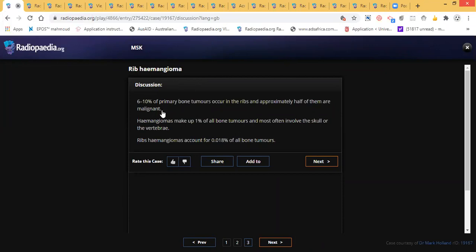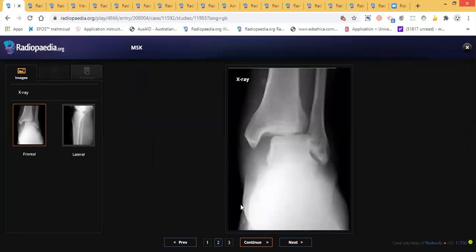Yes, let's go to another case. They like it in the MCQ again, and it can come as a short question as anatomy, and he can ask you something, maybe the next step. So he shows you this one. I think now it is too easy. When I say next step and I show you this, it is easy.